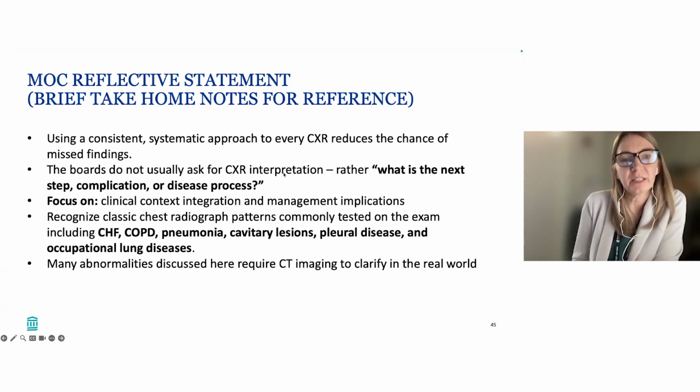You need to be able to recognize the classic chest radiograph patterns commonly tested on the exam, including CHF, COPD, pneumonia, cavitary lesions, pleural disease, and occupational lung diseases. And I just want to mention that many abnormalities that were discussed here really do require CT imaging to clarify in the real world.